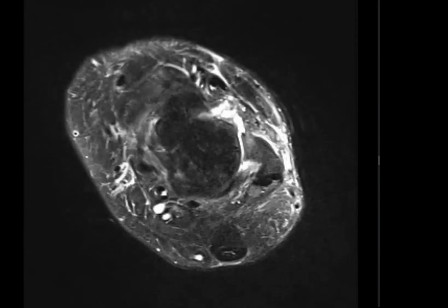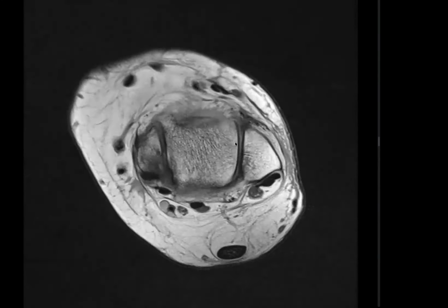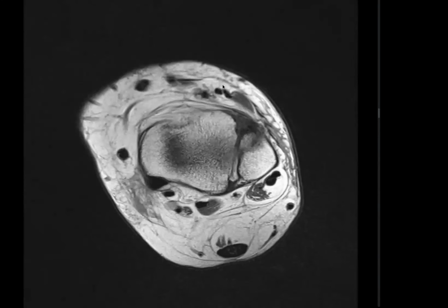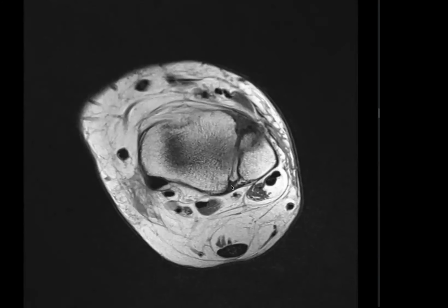This is probably something they would want to know once you've already established that you're passing: is the patient also has a high ankle sprain or an anterior syndesmotic injury. A good way to confirm is if you look at the control, which is the posterior syndesmosis. This is the band-like appearance you want to see anteriorly as well.